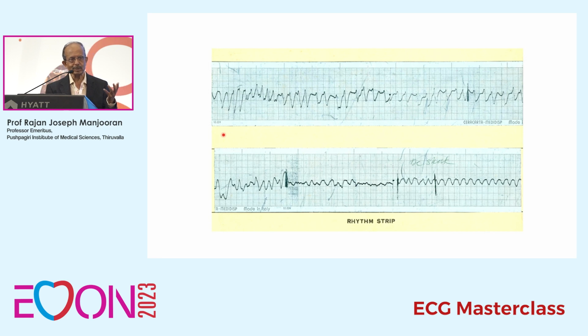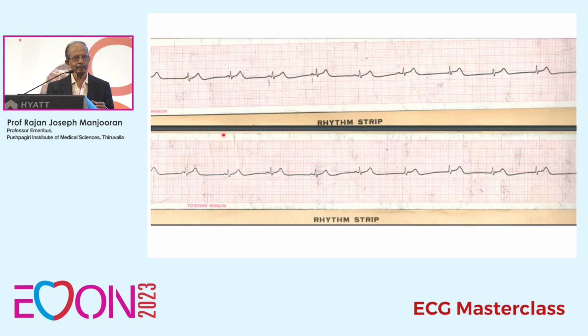This is a WPW syndrome with atrial fibrillation. Very simple. This is a polymorphic ventricular tachycardia and goes by the name torsade de pointes. This is a polymorphic ventricular tachycardia.